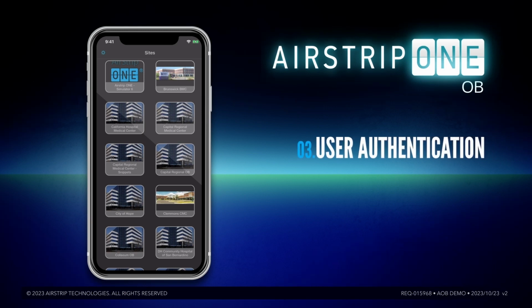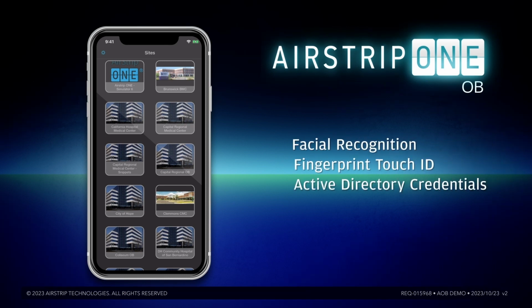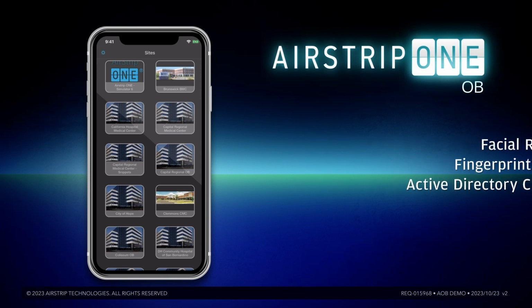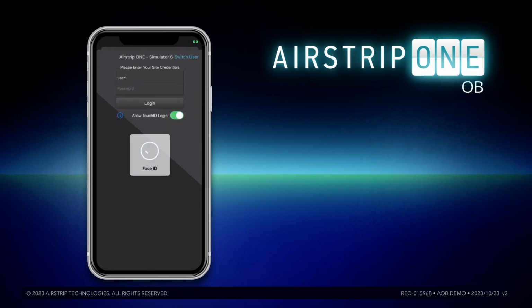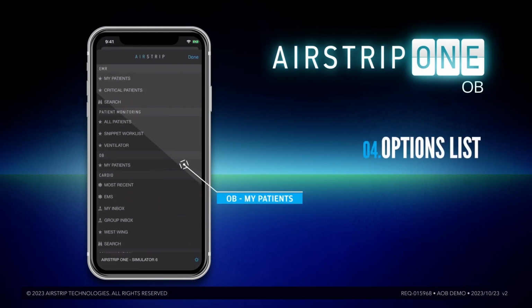Clicking on the site image will prompt the user to log into the site. You can use the device's Face ID, or enter the credentials manually. Once authenticated, all available site options are presented in a list, which includes all the patients for which a user has access.